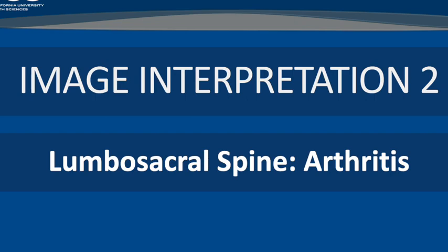To properly evaluate the lumbosacral spine for arthritic changes, a comprehensive radiographic study is essential. The minimum recommended views include a posteroanterior, PA, lateral, and PA angulated L5/S1 spot projection. However, additional views such as anterior or posterior obliques, flexion/extension, lateral L5/S1 spot, and 25/25 obliques may be necessary to fully appreciate the extent of arthritic involvement. For the sacrum and coccyx, a minimum study consisting of AP and lateral views is typically sufficient. By carefully examining these radiographic projections, we can unlock valuable insights into the underlying arthritic processes affecting the lumbosacral spine.